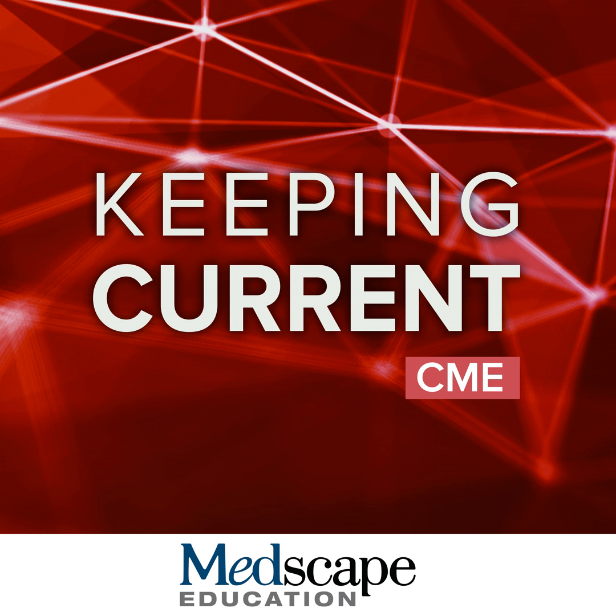Here's a patient with a known inferior wall infarct, and you can see when you look at the native T1, there is elevated T1 in the native pre-contrast T1 mapping technique. So it suggests that perhaps native T1 mapping can be used to detect infarction within the heart. And this is shown in this study where it showed elevated T1s in patients that had both viable infarcts as well as non-viable infarcts.